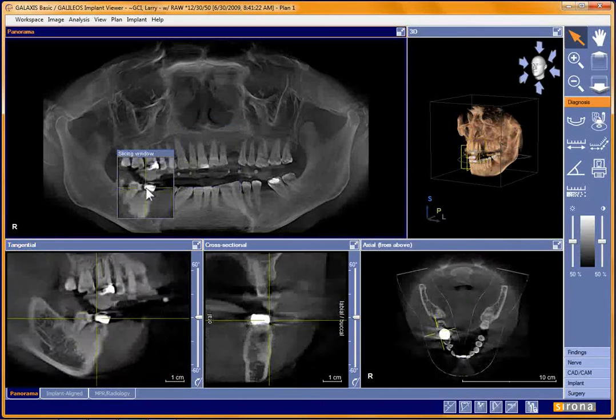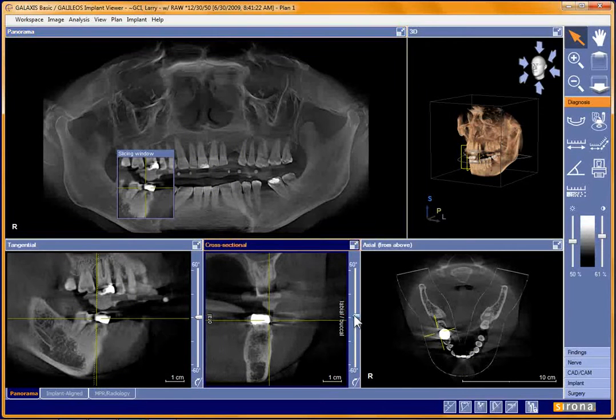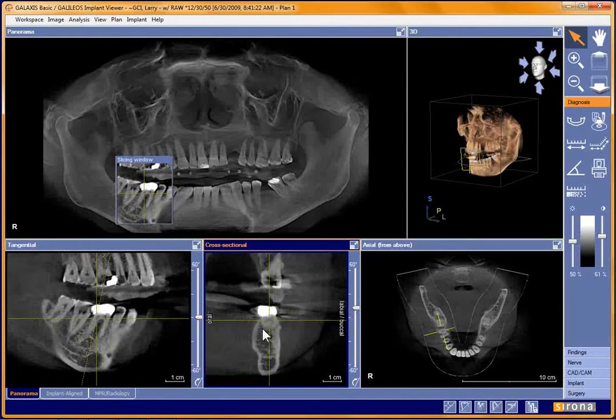Now if we go to the back here, we can then look at those teeth and we can center ourselves a little bit better, right, by double clicking. So there you can see how we can turn it more and be able to see things we might not normally be able to see. Click on this little icon to reset it back to the default value.